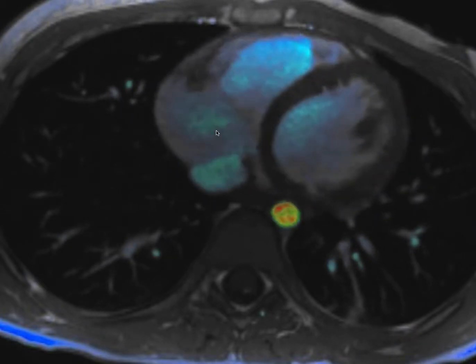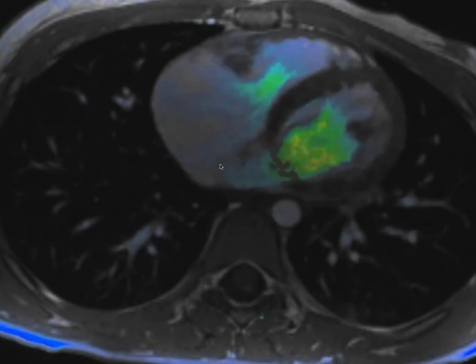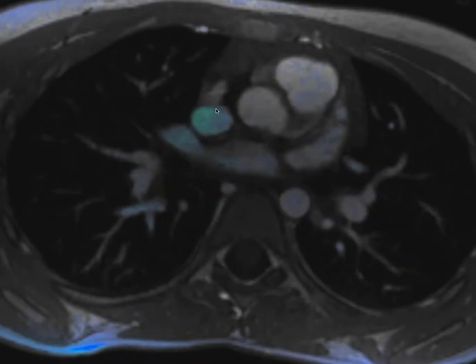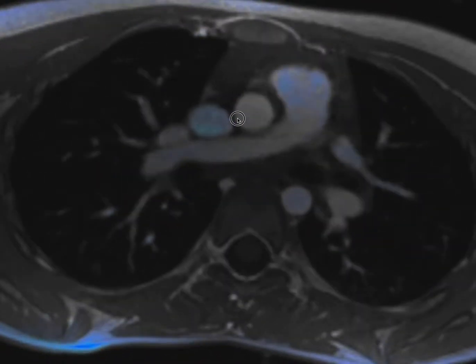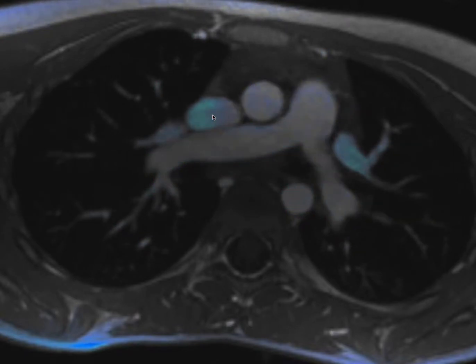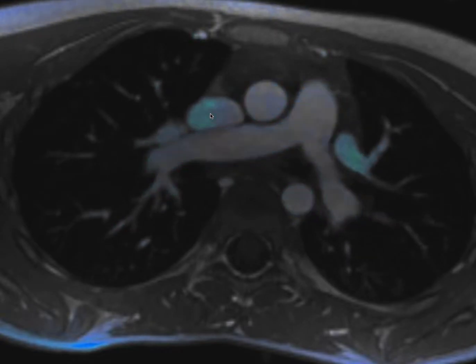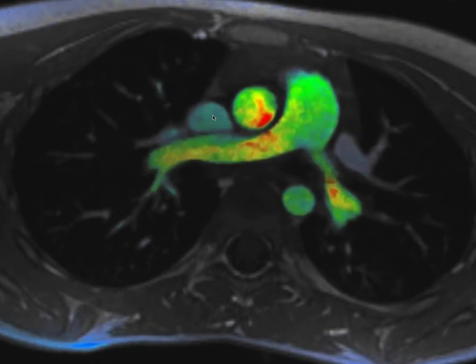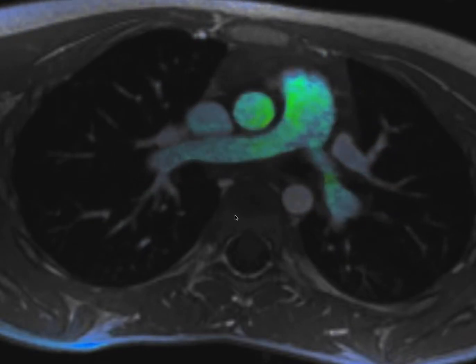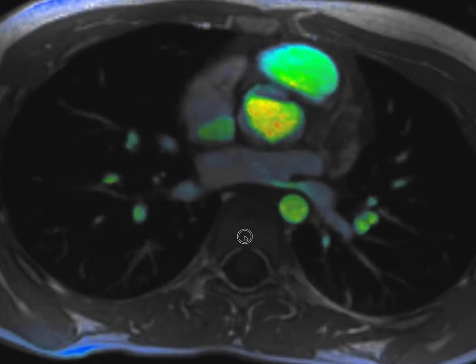This atrium receives blood from both the inferior vena cava and, if we come superiorly, from the superior vena cava. Now the superior vena cava is also a vein, and this vein receives blood from the head and the arms. So between the inferior vena cava and the superior vena cava, almost the entirety of the blood that drains into the heart is coming through these vessels. Again, these come to the right atrium.